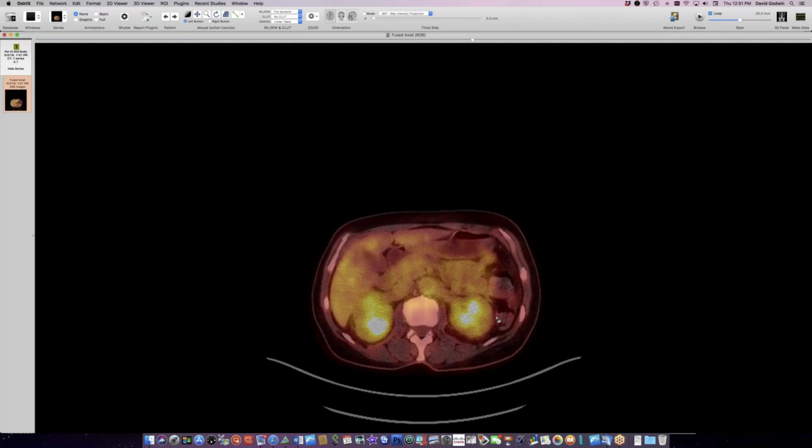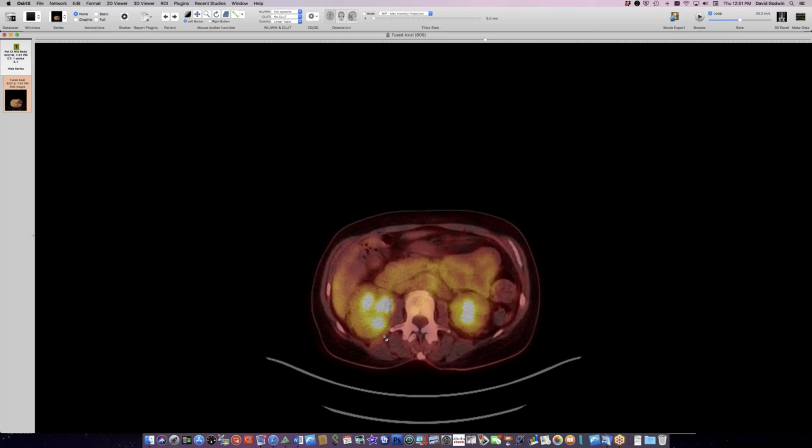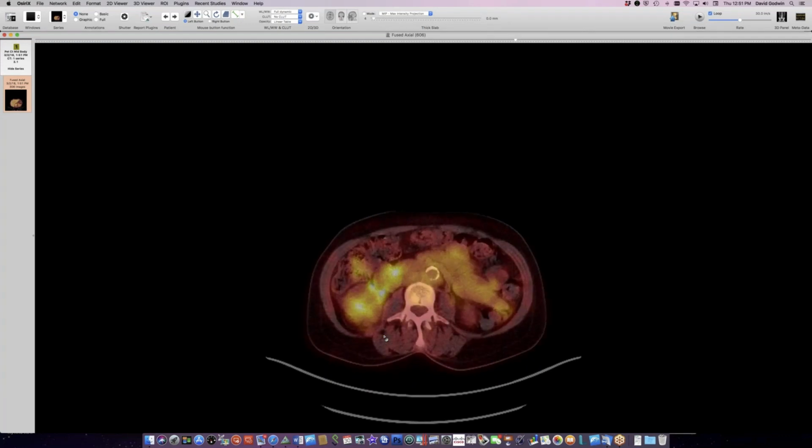So my presumption is that the abnormal tissue here that is not taking up the tracer is probably the fibrotic stuff. It's probably been there longest. And the active inflammatory component, the macrophages, are probably not that prominent there. It's probably mostly fibrosis. I don't know whether you guys have seen this sort of biphasic look to the tissue here. I've not seen that many PET scans in this condition.